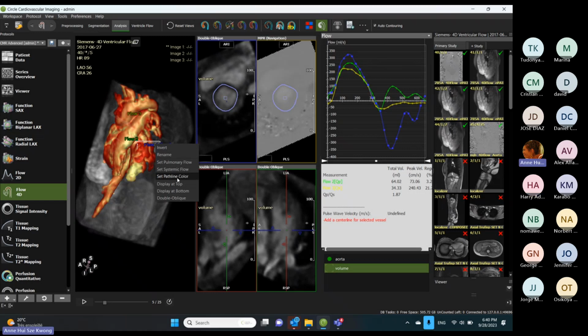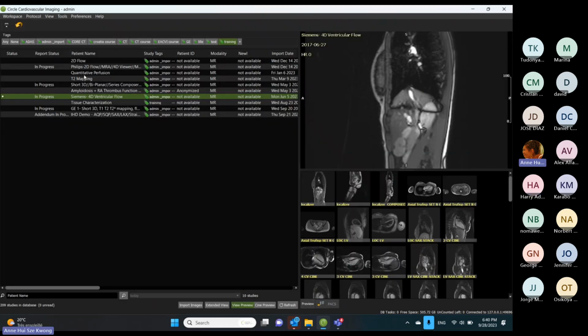You mean like maps? T1 mapping? Yeah. Okay, because we have color maps with T1 mapping, T2 mapping. We have also different... absolutely. I'd like to see other mapping. I don't know if the software also gives us the capability to see other mappings. So the mapping is done automatically.